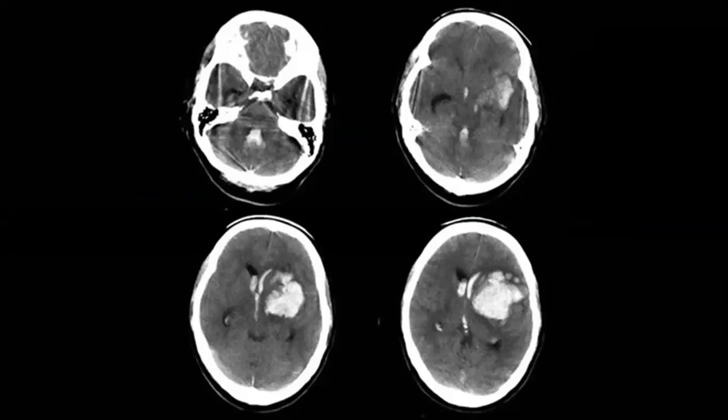Also, the small aneurysm, as you know, one of the most important questions in the exam is the commonest site for each aneurysm. For example, if you have it in the area of the circle of Willis, like here, you think about subarachnoid hemorrhage and AComm aneurysm. And if you go down to the prepontine region, you think about basilar aneurysm. So it is very important to check this table.